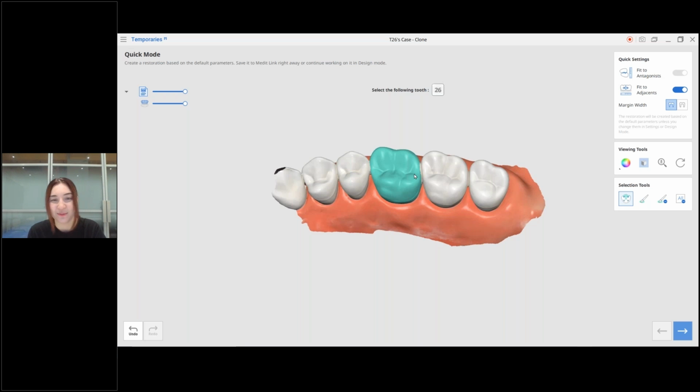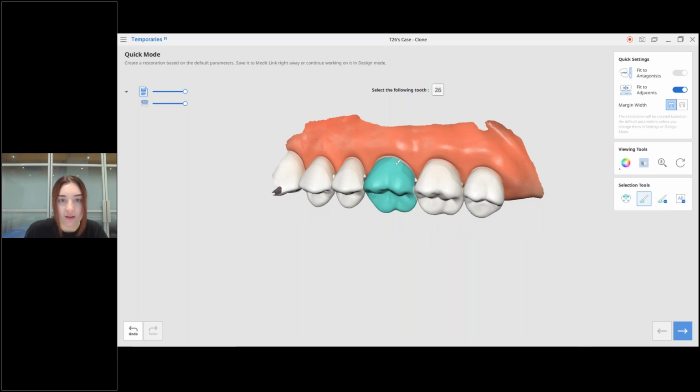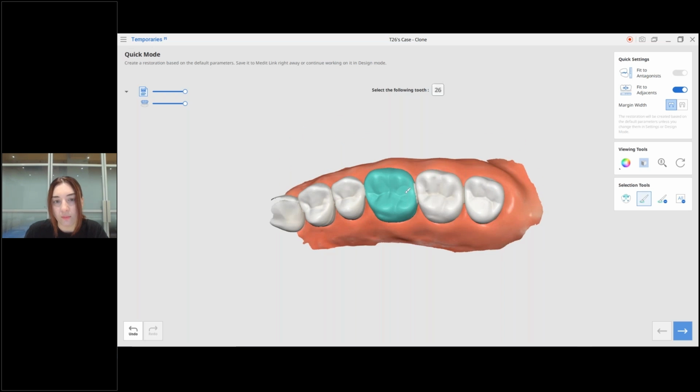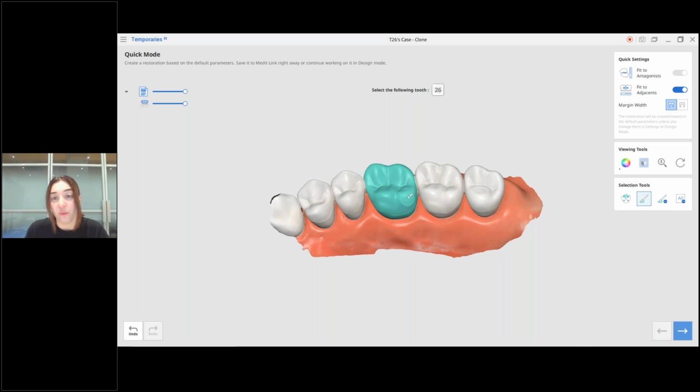Yeah, to be honest, there are times when I cannot select my tooth with a single click, but if it doesn't work, you can drag it like this. Perfect. So you can just select as you want with the brush. Generally, it's the same kind of tool that Medit offers when you're selecting most things. Yeah. So if you want to add some more details, you can always use the brush. But in most cases, you will just go with the single click, and it will all be fine.